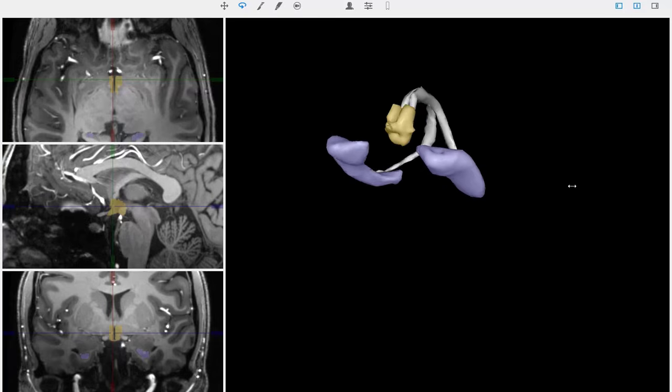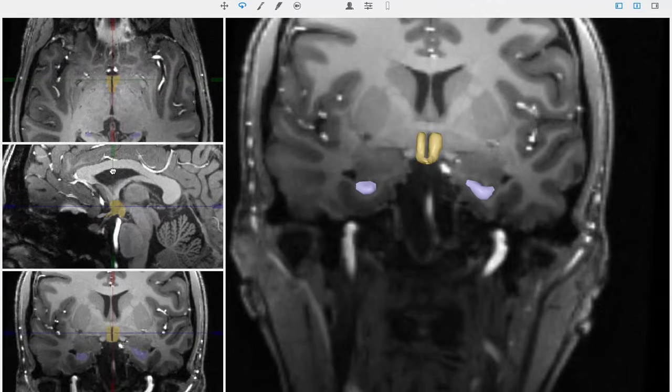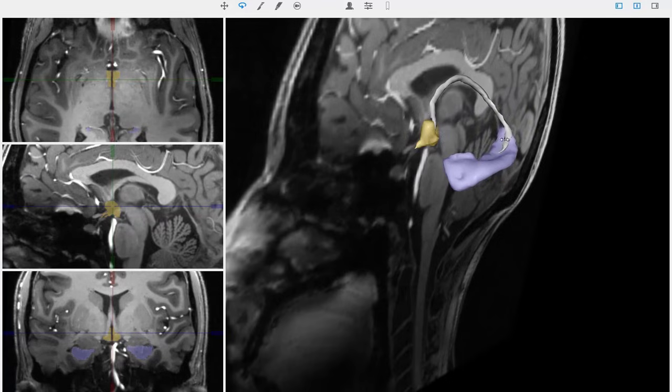It's sort of like the horns of a bighorn sheep. And this is an important part of the Papez circuit, where fibers of the axons from neurons of the hippocampus bundle together to form the fornix, wrap around, and slice through the hypothalamus to synapse on the mammillary bodies. That's part of the Papez circuit. If you're looking coronally, you can see the fornix as a midline structure just at the bottom of the lateral ventricles. If you're looking in the sagittal view, you can see the fornix here as a white matter tract just inferior to the lateral ventricles.